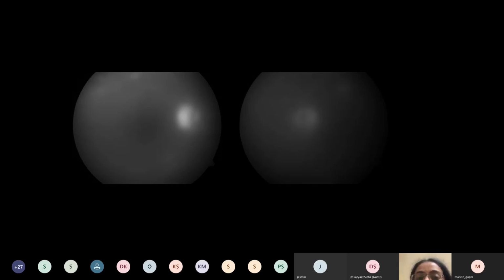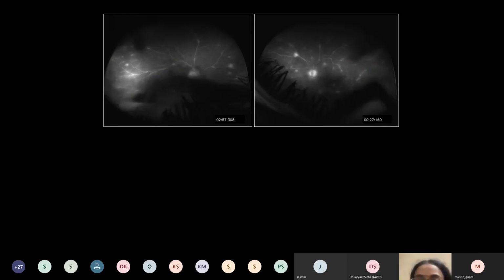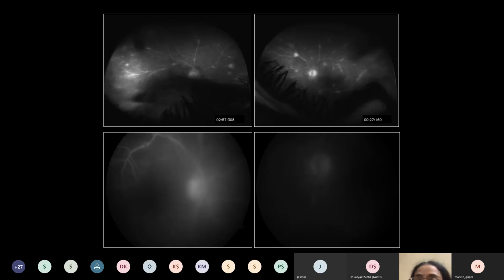So we did perform the Optos angiography in this patient. And see, we see not only the complete view of the retina, but also we see this kind of vasculitis with choroiditis. And when we see the angiography, you have these kind of lesions all over. So you have choroiditis, vasculitis bilaterally. And now, next please. When we compare it with the conventional, we are clueless. So Optos gave us complete information, and this child turned out to be having Behçet's vasculitis with panuveitis, and we were clueless when we did just the conventional angiography.